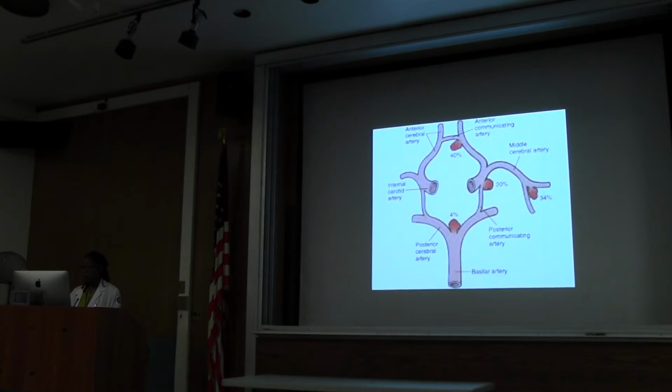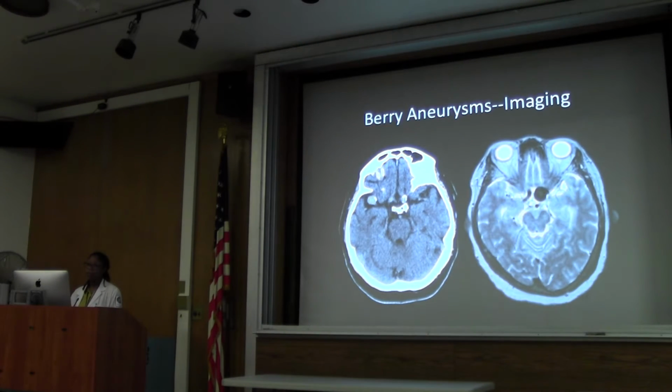So you can also see aneurysms on non-contrast CTs. It's just important to know what to look for. So in this patient here, it looks kind of normal, except that you're seeing a hyperdense focus in the sylvian fissure that has a peripheral calcification. The only thing that can really do that would be a blood vessel. That would be very suspicious for an aneurysm, and this patient should have a CTA. And you can note the other atherosclerotic changes in the ICA on the other side.